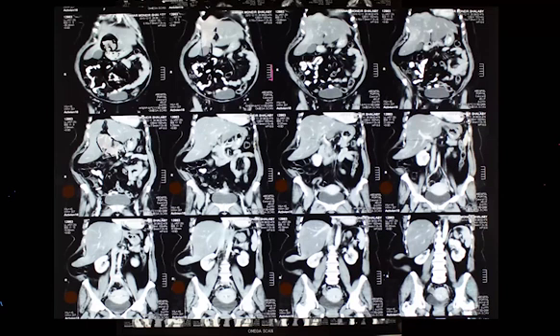The scale is beautifully depicted and shown on these diagrams, no doubt about it. Obviously, you can measure things craniocaudally on a coronal cut, and from side to side, but you can't measure from front to back on a coronal. Is it a contrast or non-contrast CT? Contrast CT.